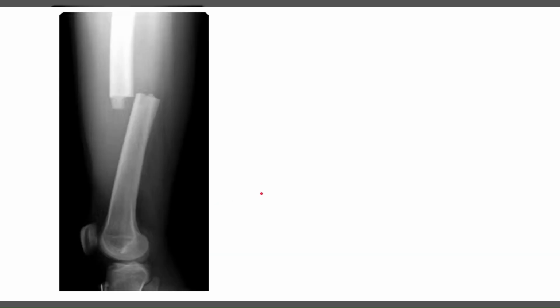Next example, a different fracture. This is a lateral of a skeletally mature femur, showing a fracture of the, I would call it middle third, maybe distal third, but let's call it middle third femoral shaft fracture that is significantly displaced, because it's at least 100% displaced. It's more than 100% displaced. Which way is it displaced? Again, pretend you are a person going from proximal to distal, and which way do you have to move? This way, and this direction is posterior, because the kneecap is pointing anterior, and the back of the knee is posterior. So this is a posterior displaced femoral shaft fracture.